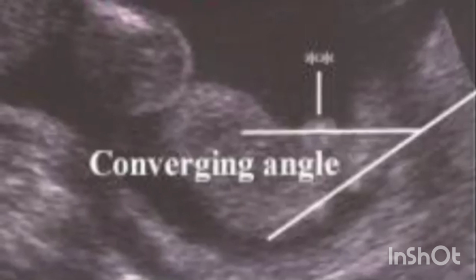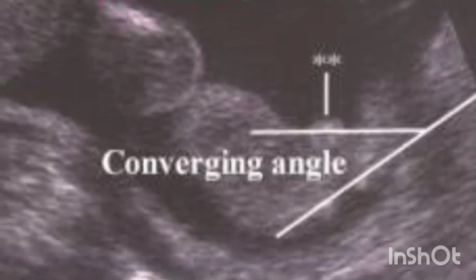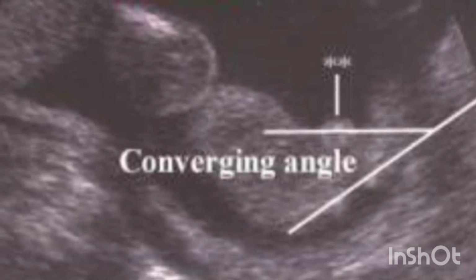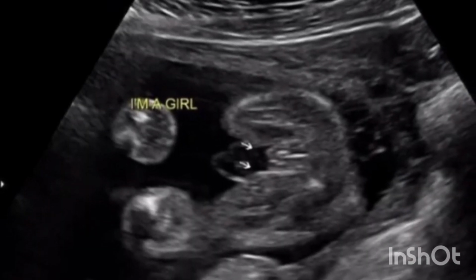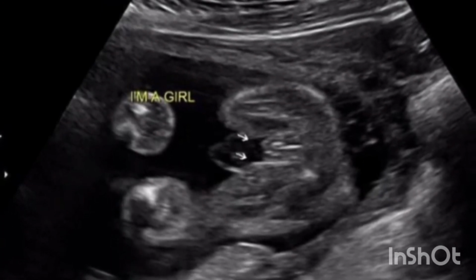Sagittal sign: if the caudal notch is pointing upward at more than a 30-degree angle, then the fetus is a boy. If it is somewhere in between, it may be harder to make a definitive determination. Baby girl ultrasound signs. For girls, there are two signs to look for: the hamburger sign. This is the moniker given to the appearance of the labia and clitoris on an ultrasound.